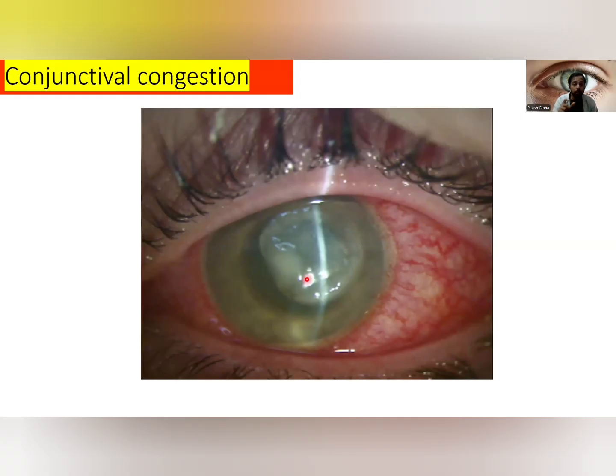until you send the patient sample for diagnosis. So here, corneal scraping is very important. Okay, you can see the corneal edema also, and a hypopyon is also visible. So it is a case of infectious keratitis, and here you can see conjunctival congestion also.